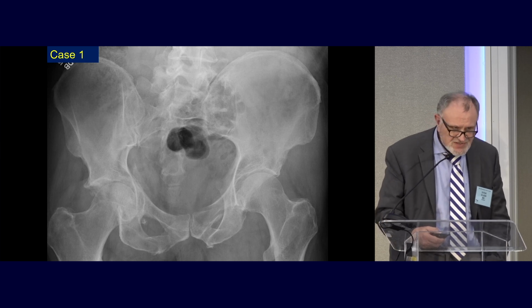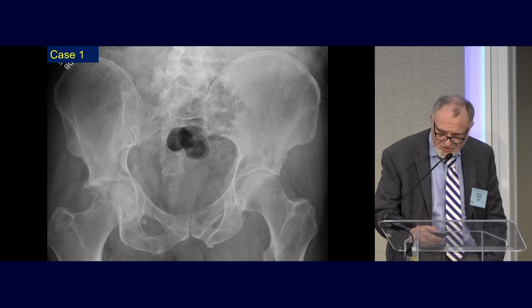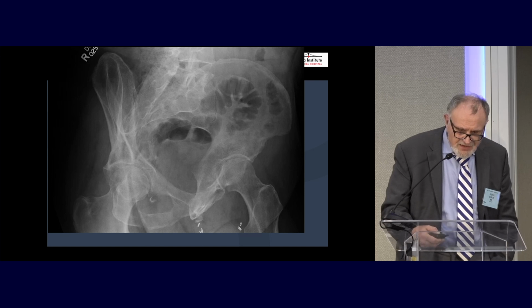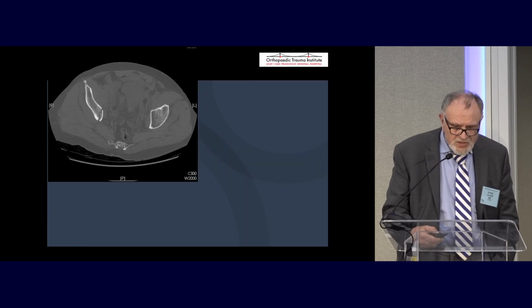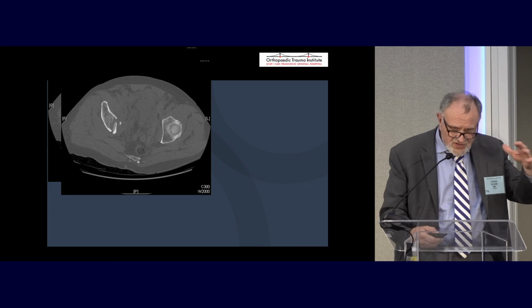And so this is his x-ray, and those of you who are in the labs, we'll go over this case in a little more detail tomorrow. But basically, you can see the femoral head's displaced, and it looks like there's potentially some superior impaction, so we're concerned about that as we look through these images. But when you look in detail, first off, it's got a sagittal plane, which tells us there's a transverse component to the fracture.